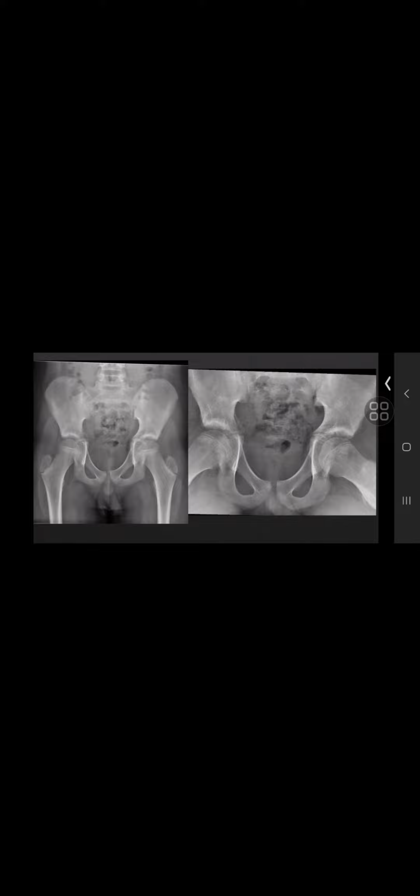And a 13-year-old male came with limping, and it's very subtle, and you can see this elevation along the iliopectineal line, and the MRI was done, which showed quite significant hyperintensity and also enhancement on the post-contrast sequences. Well, this patient actually had two lesions. So we were thinking about Ewing sarcoma initially, but it was very unusual to have two areas. So CRMO was given as a differential, and that's what it turned out to be.